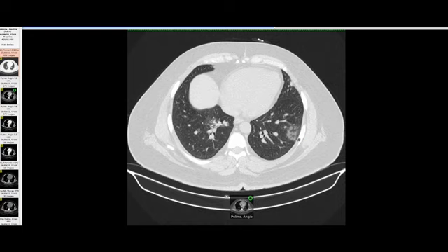Just to revise: the vascular signs, the cardiac signs, the pulmonary signs. Within the vascular signs, spatial, temporal and hemodynamic classification, giving the clot load score and percentage involvement, commenting about the pulmonary artery hypertension, then telling about the cardiac signs, commenting about RV strain. Coming to the pulmonary signs: mosaic perfusion, ischemic pulmonary hemorrhage and pulmonary infarct. So that is all about our approach to CT pulmonary angiography in a case of suspected pulmonary thromboembolism.